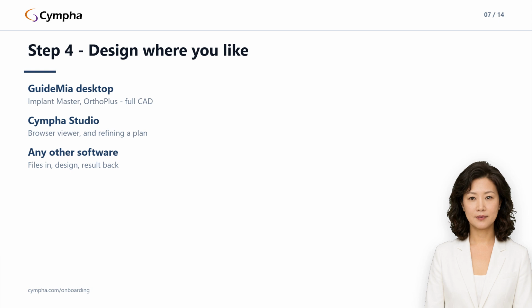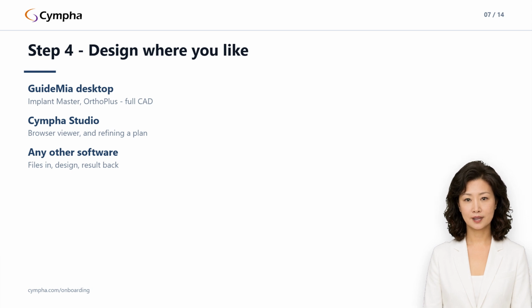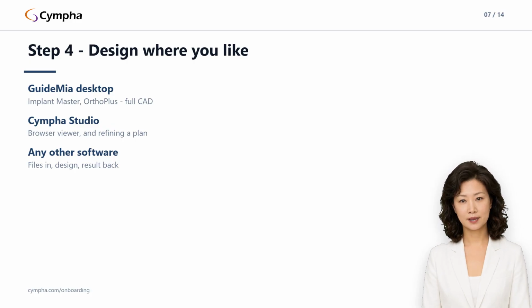3 ways to do the work. For an implant guide you would open Implant Master, for aligners and orthodontics, Ortho Plus. Both are Guide Mia's Windows desktop programs, separate from Cympha and licensed separately by your lab, and they are where you go for full control of the geometry.